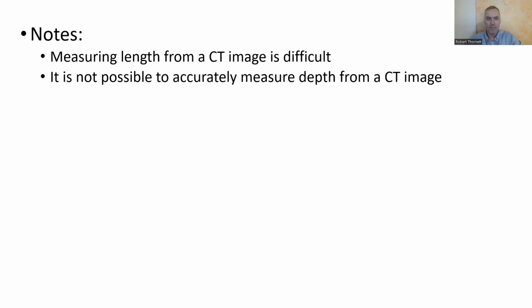Now, just so we know, we're not saying here that we can measure the specific length of a myocardial bridge just looking at it like this, because it's difficult to know exactly where it actually goes into the heart and exactly where it comes out. It's easier said than done, but they can usually get a pretty decent estimate. For example, in my case, the estimate was not too far different from what it actually was during surgery. I think it was like 2.7 something estimate, 2.5 something surgery.